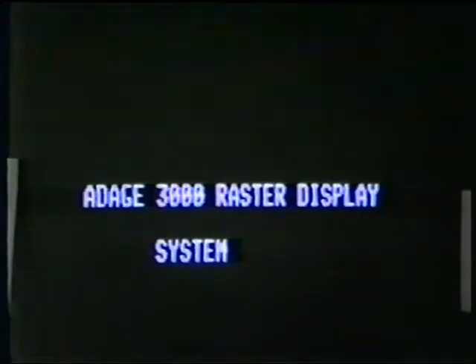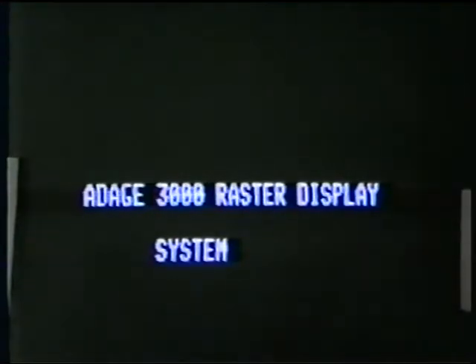The work was partly done by the University of North Carolina, and the original work that you saw using the CT slices was done using the Adage seismic display package, and the hidden surfaces using the Adage solids display package. Please contact Adage Incorporated for more information.